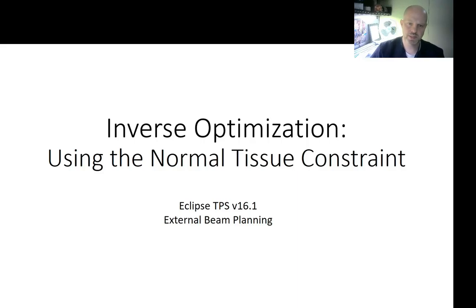Hi, my name is Justice Adamson, and in this video we're going to talk about using the normal tissue constraint during inverse optimization and some of the details there. And this is for Eclipse treatment planning system version 16.1. All right, let's get started.